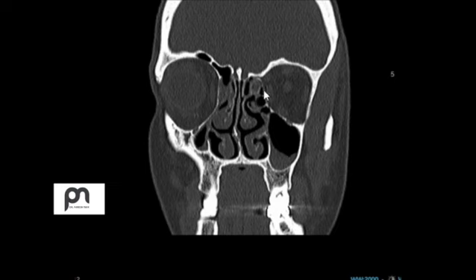Also, you can notice this air cell, as compared to this part, it is unusual. Over here, you can see the optic. Over here, you can still see the eye, and that way you can notice that there is slight rotation of the head.